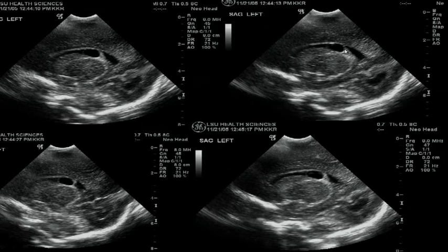If they're not normal, what is it most likely going to be? It's not Down syndrome. Trisomy 18, Edwards syndrome. And so when they do an OB ultrasound and they see a choroid plexus cyst, or you guys see a choroid plexus cyst, you need to look for any other abnormality: heart abnormality, kidney abnormality, rocker-bottom feet, the clenched fist, and the thumb might be in this index finger over here. I can't do it because I don't have it. They have funny looking heads. But you have to make sure you see both hands open because one hand might open, the other one might be the clenched fist. So make sure you see both hands open.